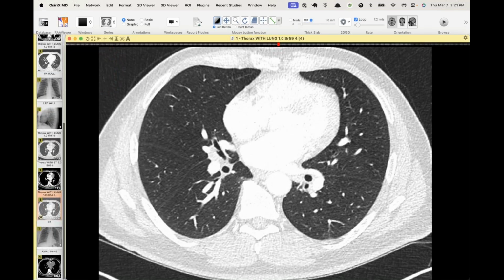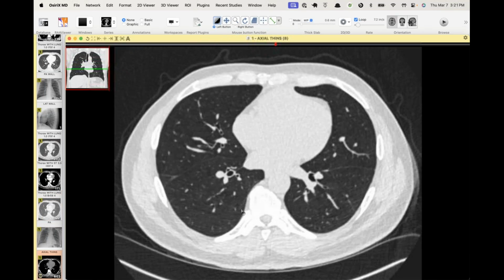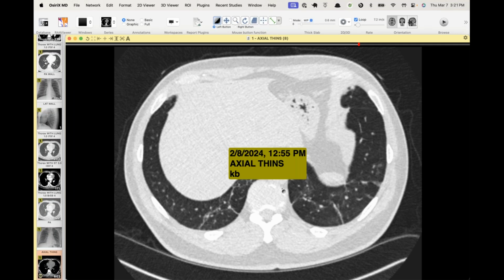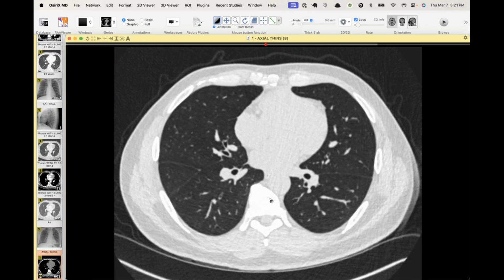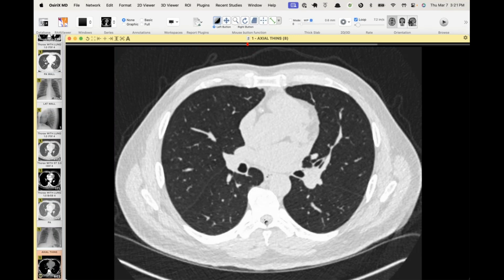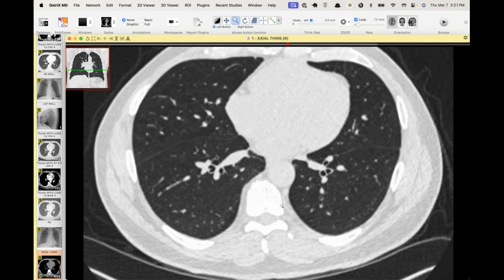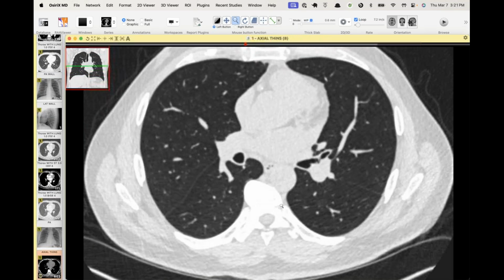Then there was a CT guided biopsy, and a bronch at some point on the outside. Nothing grew. And now this is the most recent one, which is February, a couple months after he had a treatment for a related, or unknown at the time related, but now presumably related multi-systemic process.